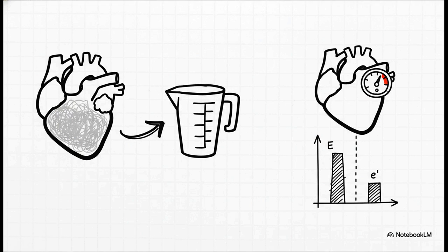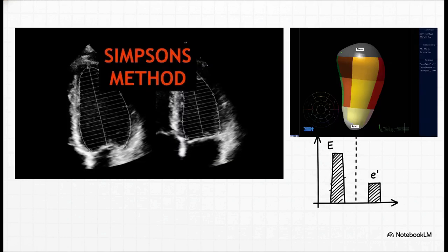How full is the tank? TEE gives us 2 great ways to figure this out. The most direct way is just to measure the size of the left ventricle at the end of diastole, the LVEDV. You can do this in 2D or even 3D.